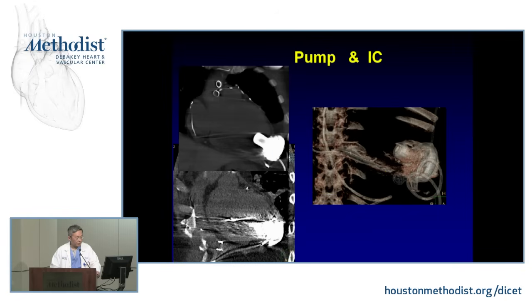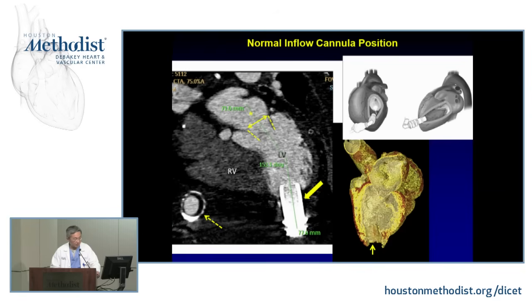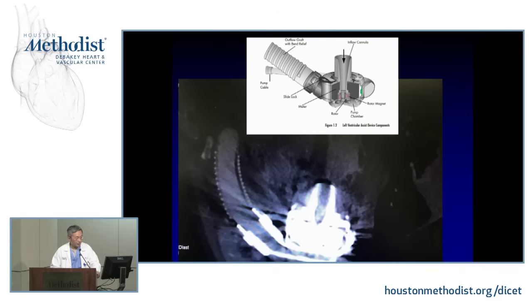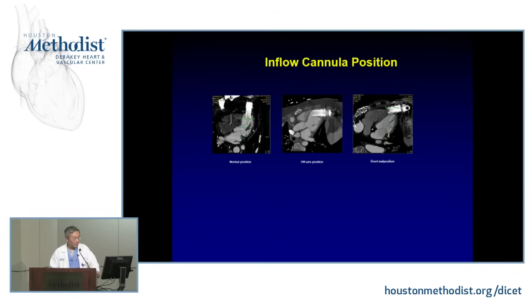I'm sorry. So the previous one, this one is the inflow cannula for HeartMate 2. This is HeartMate 3, and I'm sorry, HVAD, this is HeartMate 2. So very different, obviously. And you can see the position of the cannula could be extremely variable.